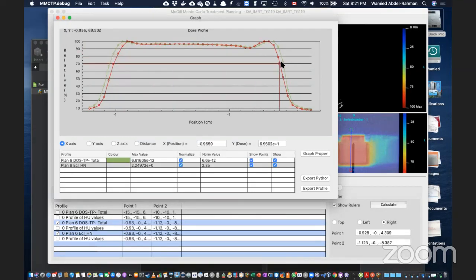Okay, so this is the difference between the Monte Carlo and the Eclipse. I don't know why the profiles are not matching 100%. There might be some geometry problems that I need to look into more. But at least I get the proper shape. This could be the leaf gap. Maybe it could cause this problem, because it seems that there is more transmission. I'm not sure why.